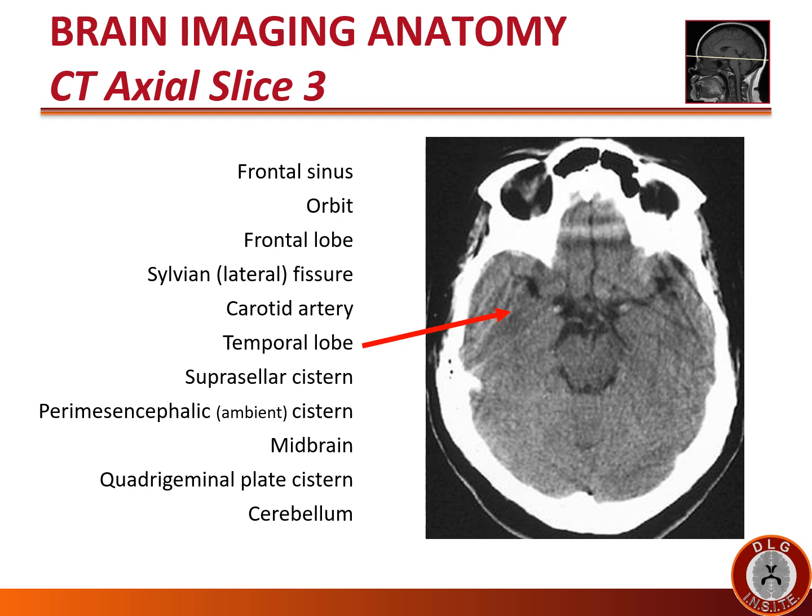This is the temporal lobe. Anytime you see the sylvian fissure on an axial image, posterior to it will be the temporal lobe. Note also the very medial temporal lobe forms a little knuckle protrusion that is sometimes called the uncus, U-N-C-U-S.